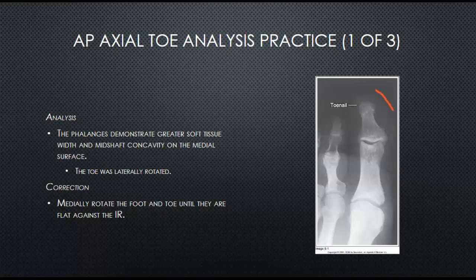You can also see the concavity on that medial surface there. So the toe was rotated laterally. In order to correct this projection, we need to rotate the foot medially until the foot and the toe is flat against the IR to obtain the projection that we require.